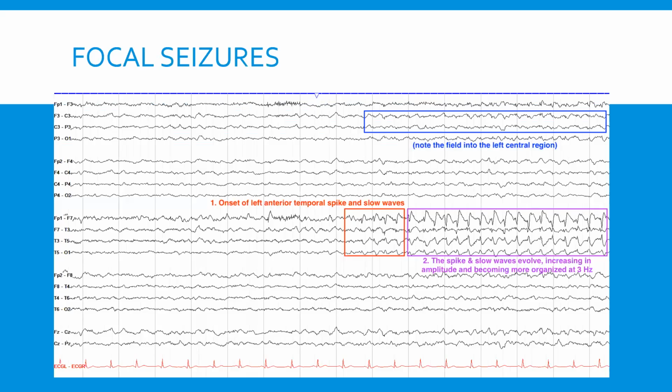Okay, so this is an example on the EEG of a focal seizure, and the main thing I want you to take away is that with each seizure there's a ramp up period, right? So on my eye, I think I see some sharp stuff here. So this is probably where it starts to get going, and here you can see the amplitude, or the height, how tall it is. It's about this height, and you can see the height of it gets higher and higher and higher, and for lack of a better word, looks angrier and angrier.